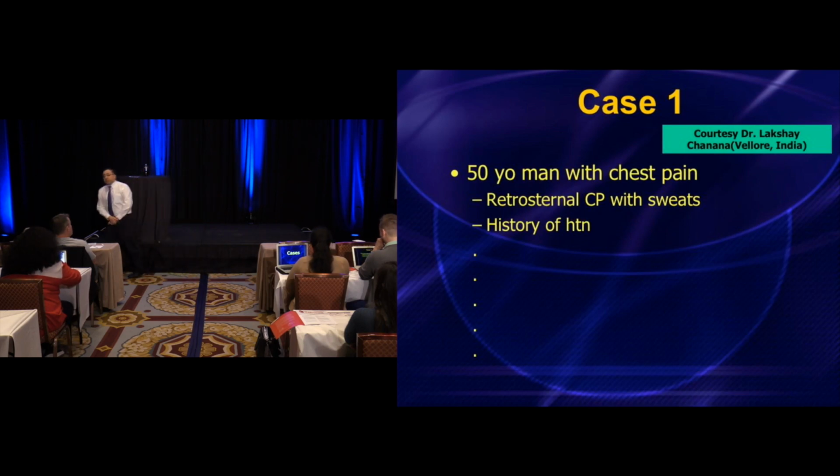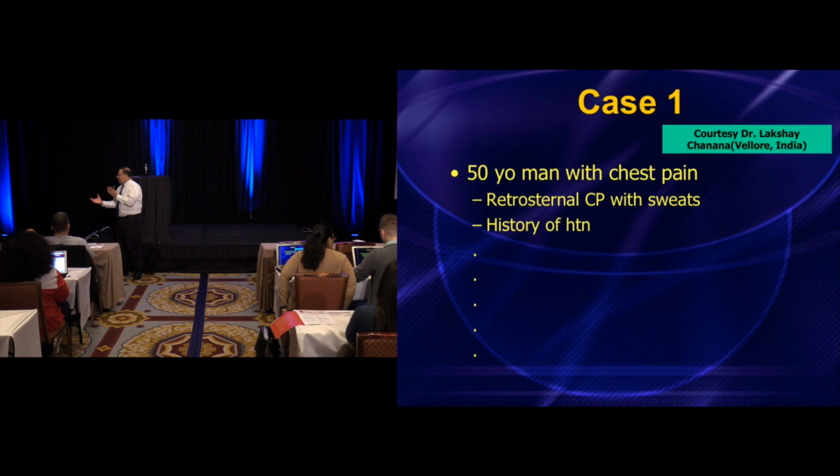All of these, by the way, are real cases. Some of these are ours. A lot are screw-ups. And my hope is that you will learn from our mistakes, all right? It's good to learn from your own mistakes, but I would say it's even better to learn from other people's mistakes, right? The first one wasn't a mistake, but it's a great case to start the show with.